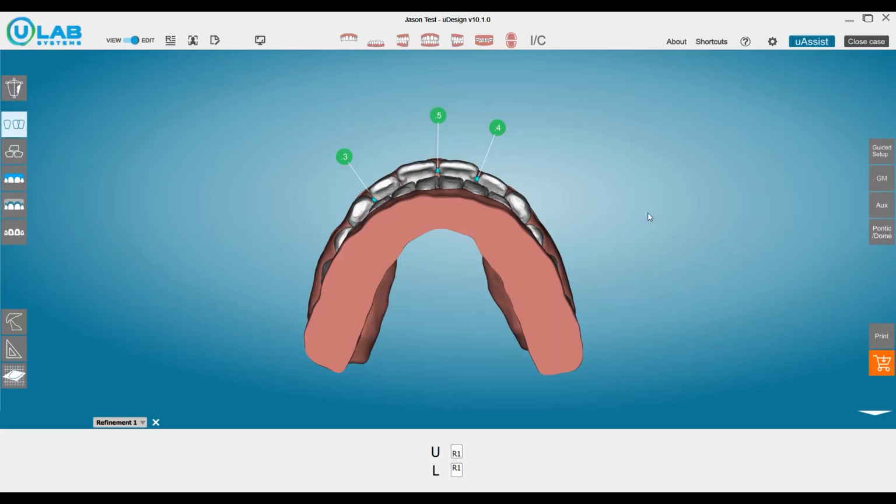Managing spacing and crowding cases can be a little tricky your first time. Space management is the key to your success, and this video will go through some of the ways to tackle these scenarios. For a spacing case, a more predictable way to close spaces is by retracting the arch, assuming you have enough overjet to work with.